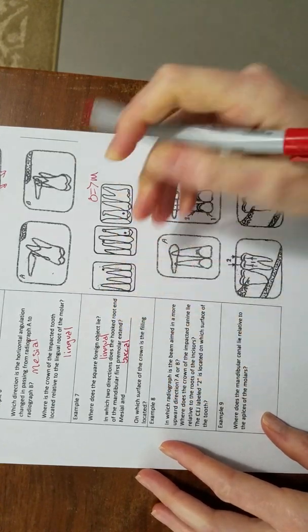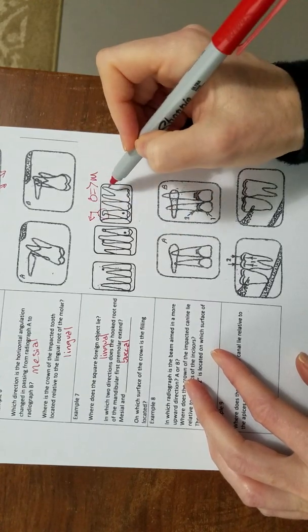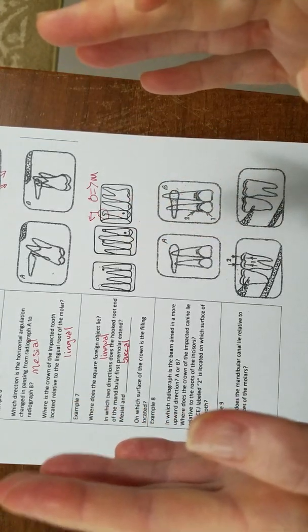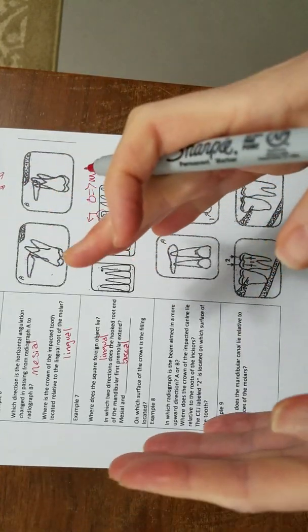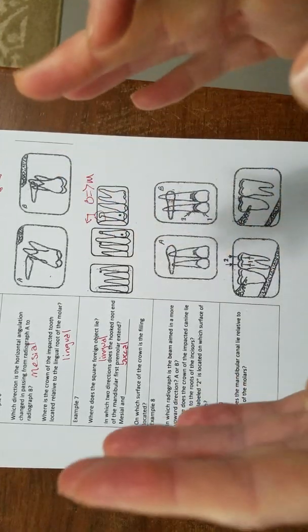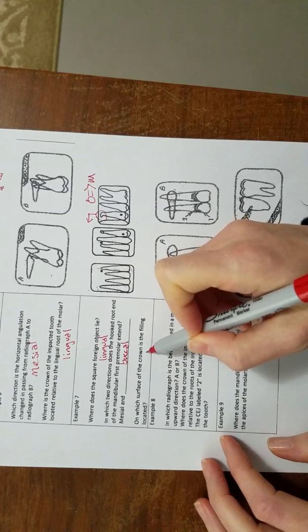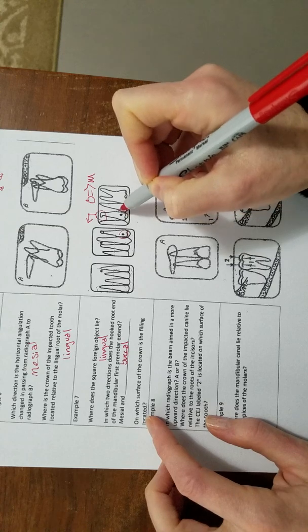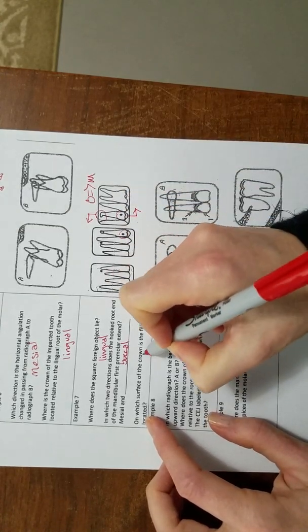Hope that is clear. So this is going in this direction, and we know that the beam in all of these is going slightly more mesial. That's how it would be if you're turning your tube head, turning your beam for each of these progressive shots, you know you're coming a little bit more mesial. And then on which surface of the crown is the filling located? The filling started out here, it ended up going a little bit more this way, so this must be lingual.